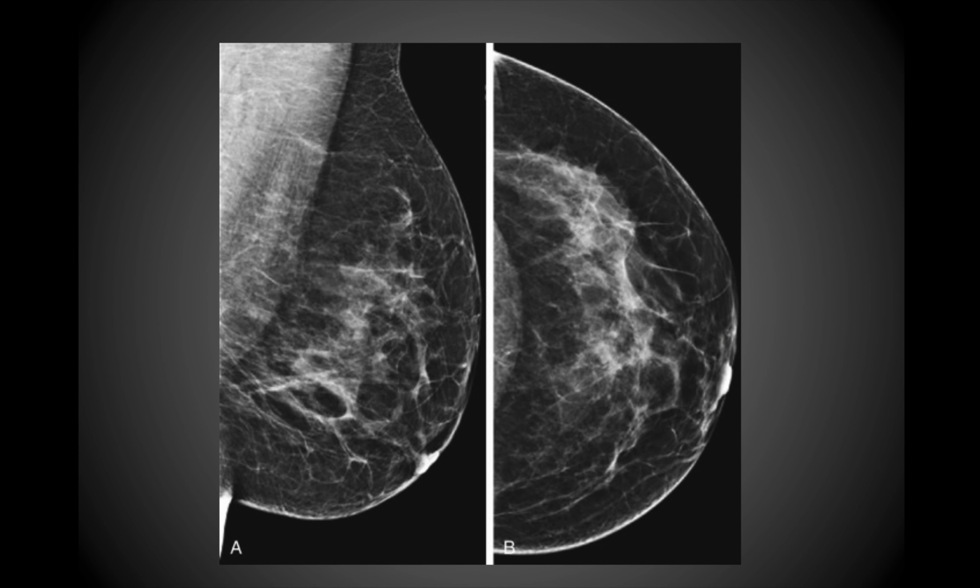And so this is where you can see more of the breast tissue. You can see the pectoralis major over here, the nipple over on the right, and then you can make out again a number of the ducts, milk ducts that are located within the breast. And so, when we're doing mammography, this would be a routine mammogram, where we're looking for any evidence of nodules or tumor-looking structures, which we don't see.